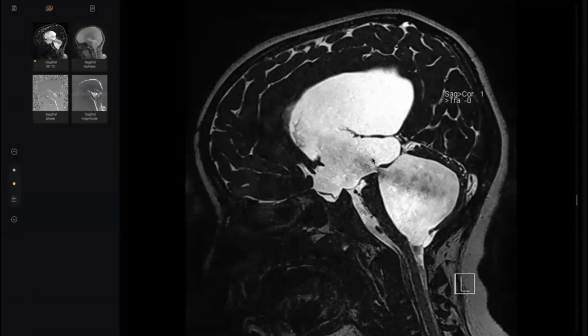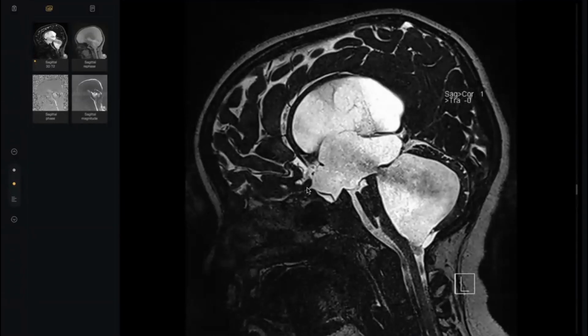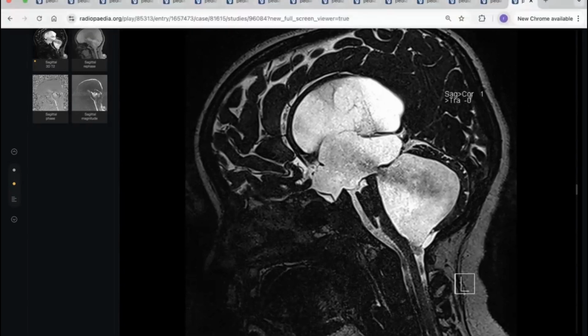When you open the third ventricle to the suprasellar or the infundibular cistern, when you make an opening in a ventricle, what is the name? Ventriculostomy. Yes, this is the ventriculostomy. See, there is no separation between the third ventricle and the suprasellar or the infundibular cistern here. Okay, thank you, doctor, so much. Thank you, sir.